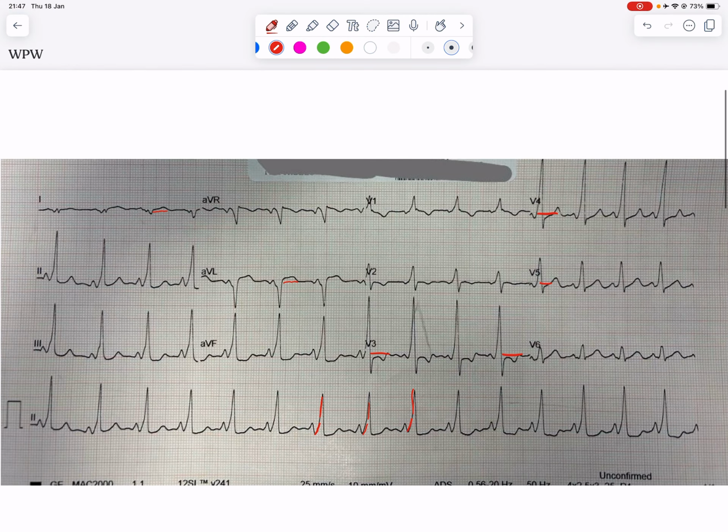So the question is, is this patient having an infarct? You must always be wary, if you're seeing changes in all of the leads across the ECG, that there's something else going on. There could be something like a main stem infarct, where you can have ST elevation in aVR followed by ST depression in the other leads, but we'll deal with that later. For now, there should be a few alarm bells ringing in your head: short PR interval, delta waves, pseudo-infarction pattern. We need to be thinking about something.